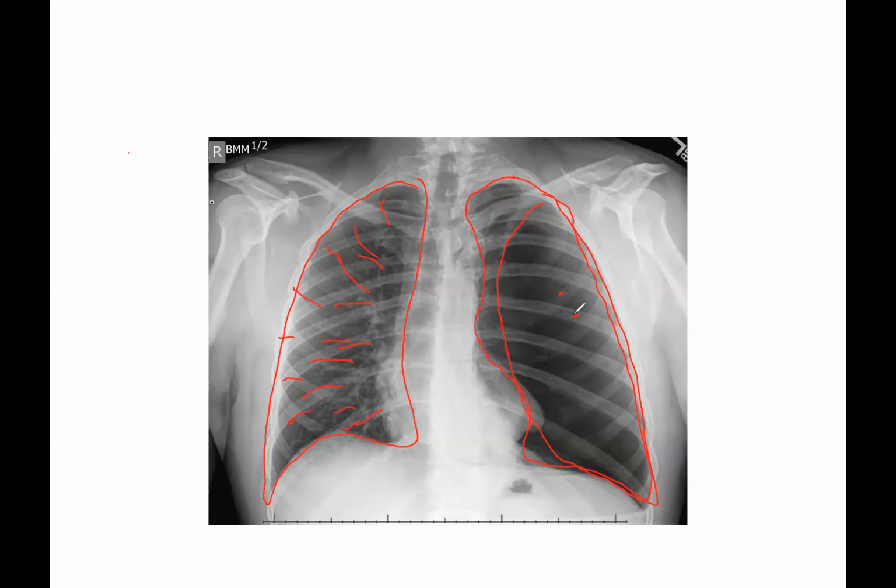That means that the lung has collapsed. Okay, so this is not a typical image, but I want you to notice something. Look at the mediastinum. It is shifting to the contralateral side.